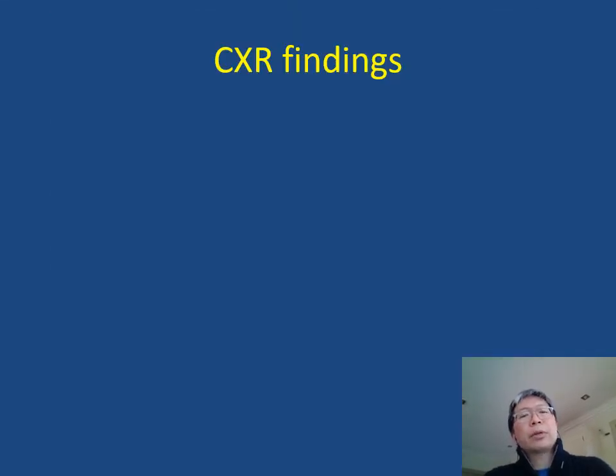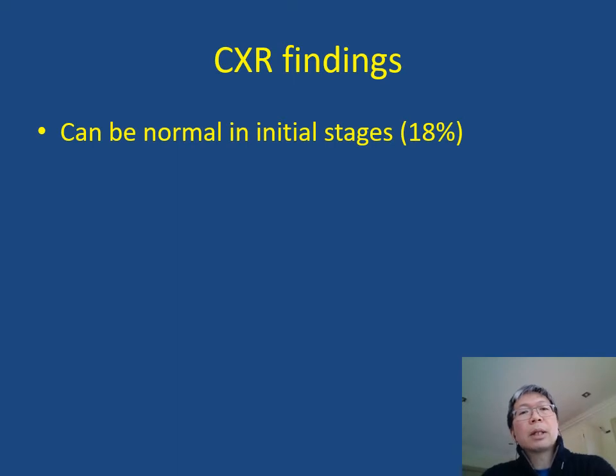So, the chest X-ray findings on COVID-19 patients. It is worth pointing out that the X-ray can be normal, particularly at the initial stages of the disease.